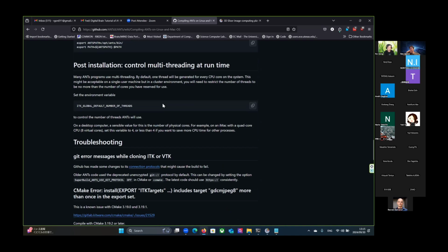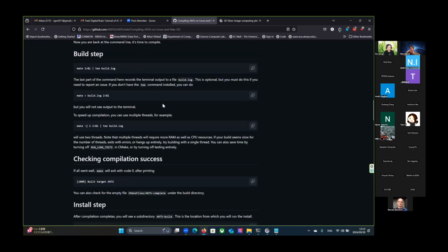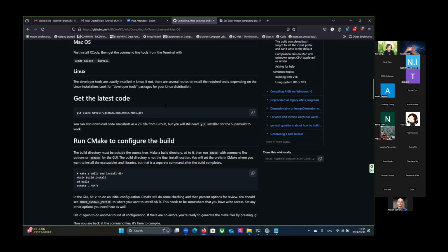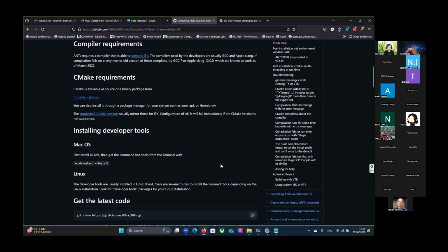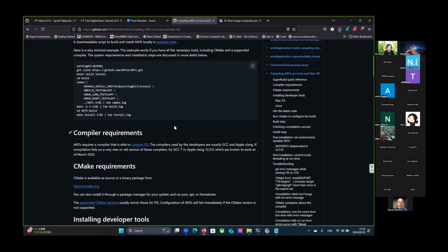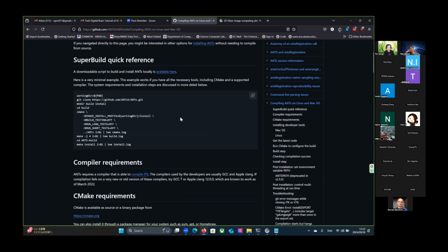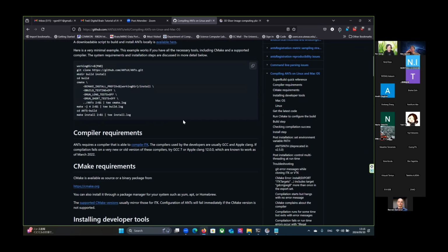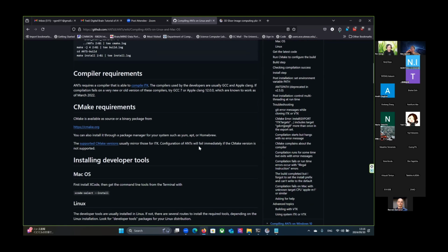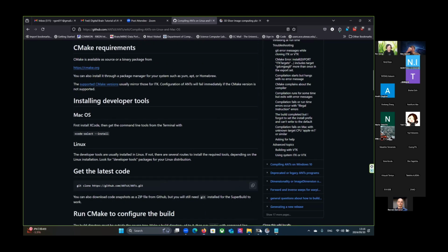The other way, a binary where the software is downloaded, or conda, which installs automatically, also exists. The conda version is the Python one. If you want to use the programming one, you need to do this. So conda is for Python, that's different. But anyway, we can use this way. There's a tutorial on here, please follow this to install ANTs. That might be the hardest part, but it's something you need to do.